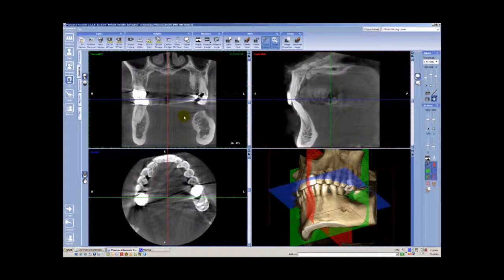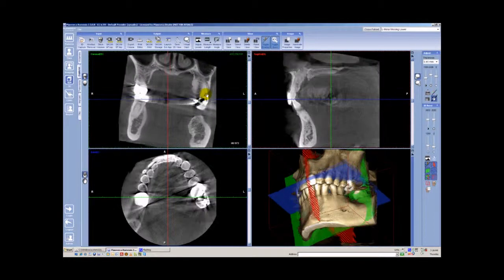If I was to use the right mouse click in any one of the slice planes, sagittal, coronal, or axial, do a right mouse click and hold. Again, the cursor turns into a hand, but now with a curved arrow. This means I can rotate the data set.